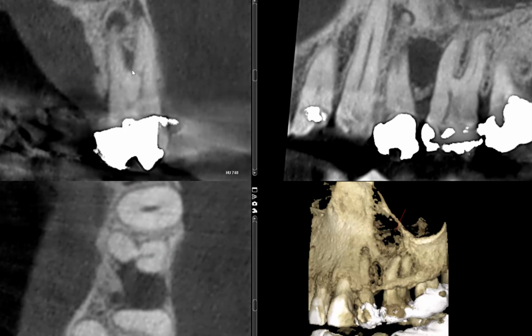But when I see that extending right into this lateral radiolucency, and knowing that this tooth is necrotic and with periapical radiolucencies, I think this fits well with all the other pieces of the puzzle, that this radiolucency is most likely coming from this lateral canal that's exiting to the furcation, which means it is all an endodontic-related issue, and that if you were to do a root canal therapy and provide a good, successful therapy, this area, despite how big it is, should heal normally, like any other large periapical lesion.